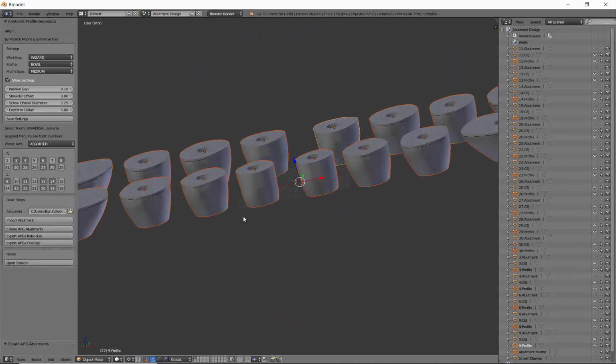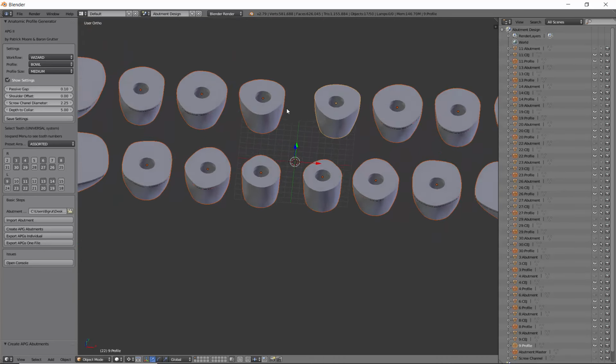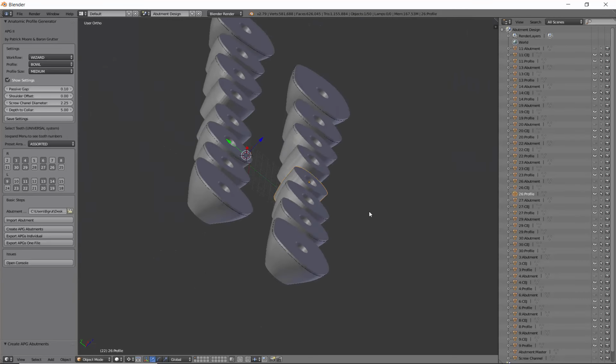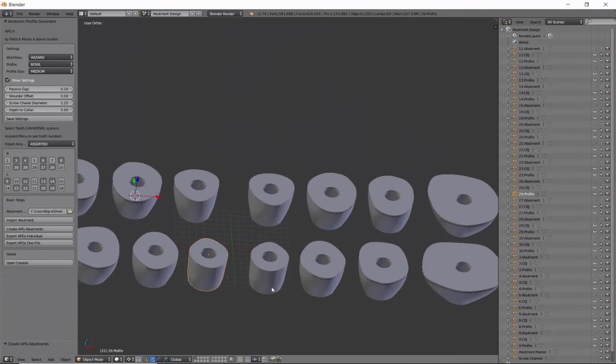A little bit of background. I apologize I didn't get to this sooner. So you can navigate the software. If I press the left button, it just clicks on different areas of the screen. If I right click, it allows me to grab objects, which I don't want to do. If I press the wheel button on my mouse, I can toggle around. Okay? If I hold the shift button, I can move everything around.